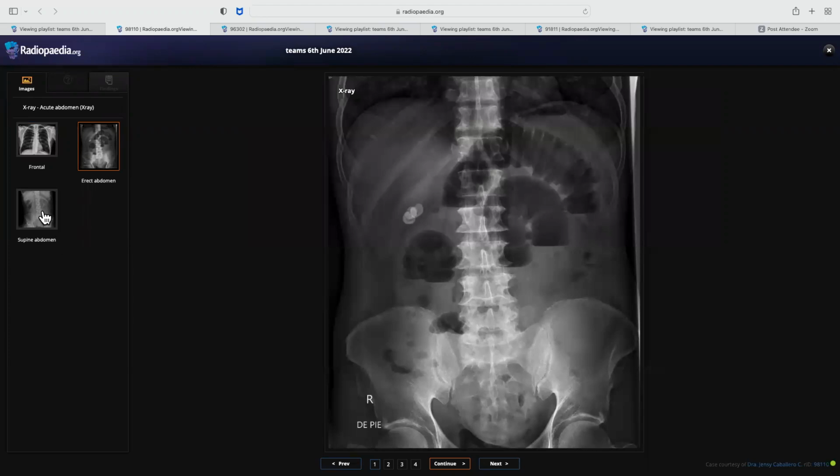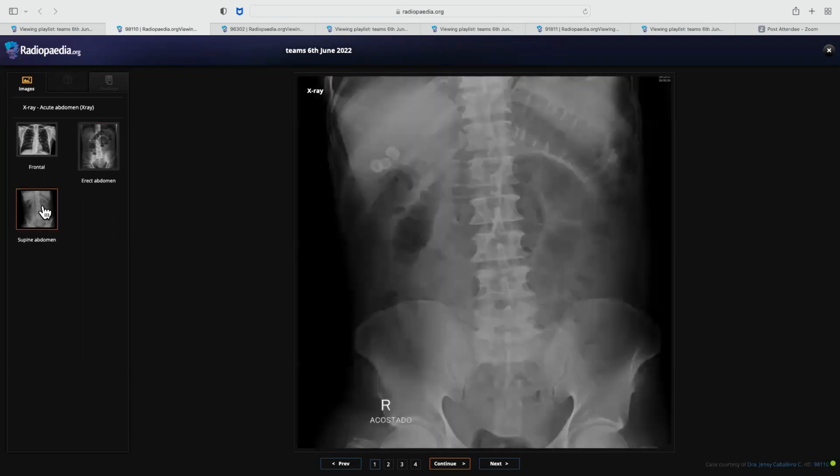Okay, yeah. I'm provided with an abdominal radiograph, frontal projection, erect view. Most striking feature that I can see is multiple dilated bowel loops within the center of the abdomen. They show prominent loops and air fluid levels within them. There are multiple calcified densities seen in the right hypochondrial region, confined within a sac, maybe within the gallbladder. Three of them show laminations within them. There is no evidence of any free air within the abdomen, and no air within the biliary tree.